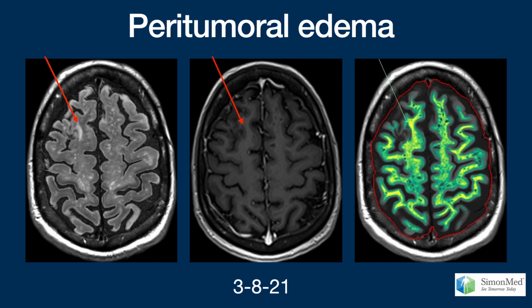Now look at the myelin image. The myelin is back, except for a small defect corresponding to the encephalomalacia. So, was it really gone in the first place? No, it was not, but simply masked by the edema infiltrating myelin layers. Once the edema has resolved, most of the myelin has moved back into the so-called fast relaxation compartment and is again revealed, with only the encephalomalacia exhibiting myelin loss.